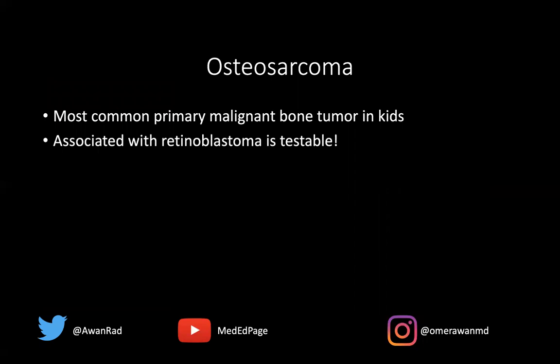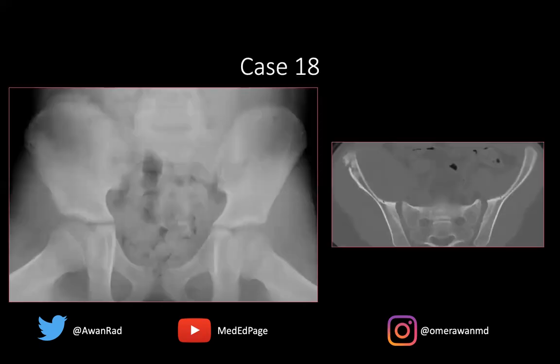The most common primary malignant bone tumor in kids. The association with retinoblastoma is very testable on the shelf exam. So definitely want you guys to remember that fact, okay? Case 18, we have an AP view of the pelvis.